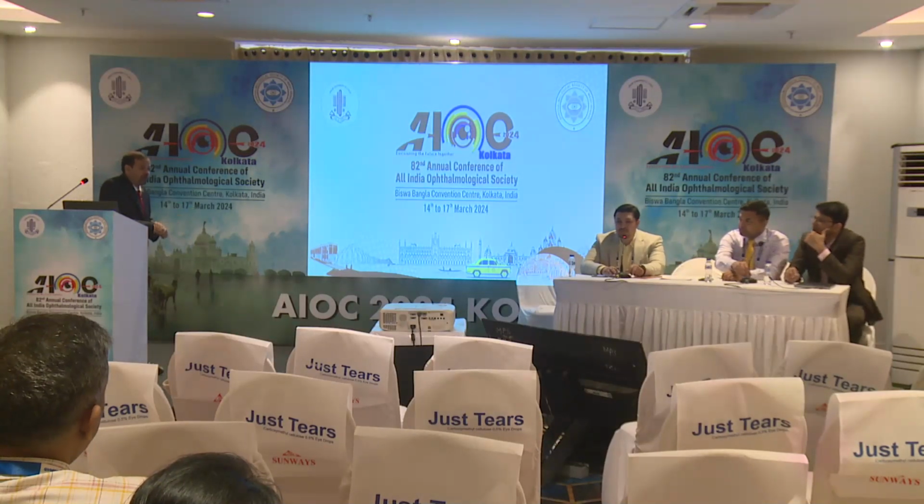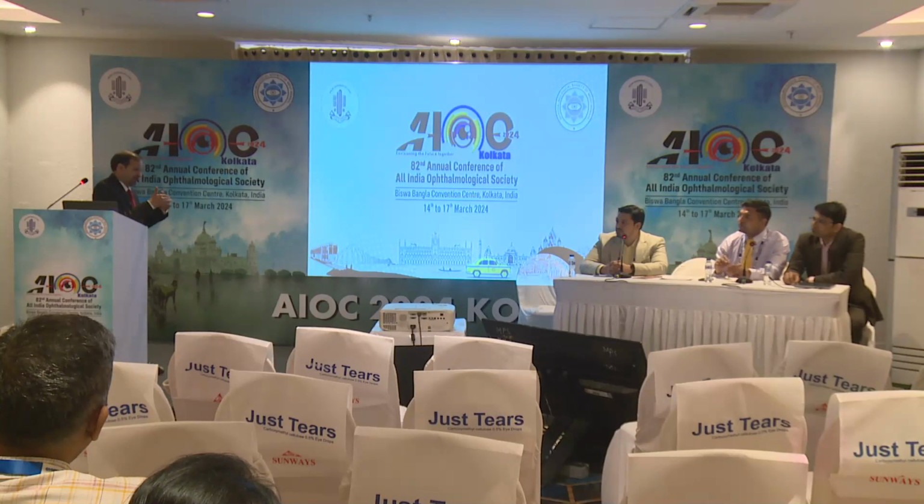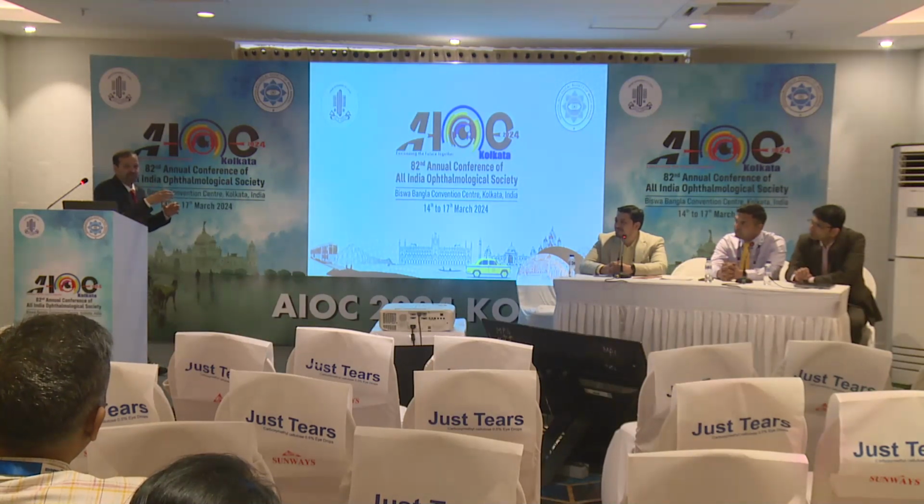Yeah, that is one problem with OCTA. I think the repeatability is a little dicey as of now. The measurements are different for different machines. What you see, we don't actually know whether it is true, because in a lot of software developments, in trying to make the image look beautiful, they feed in a lot of data so that the gaps are filled in. So a lot of these images will actually not show what is actually there.